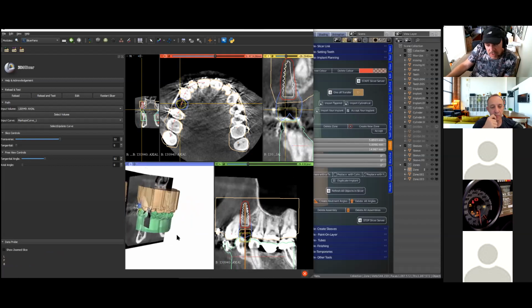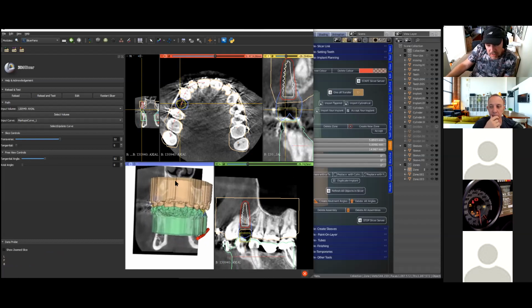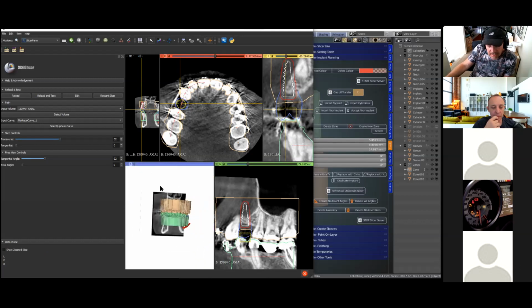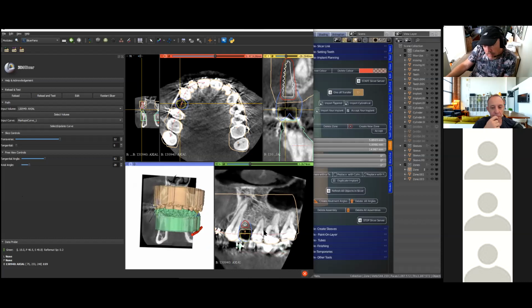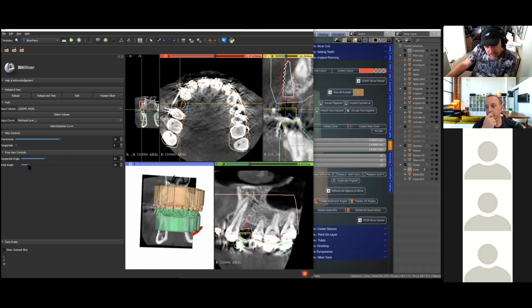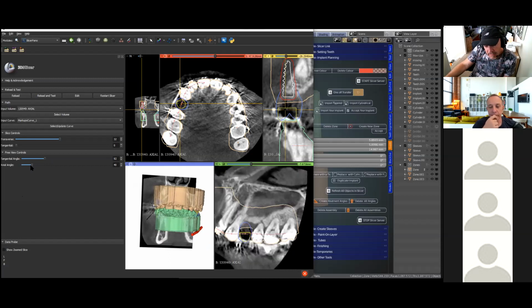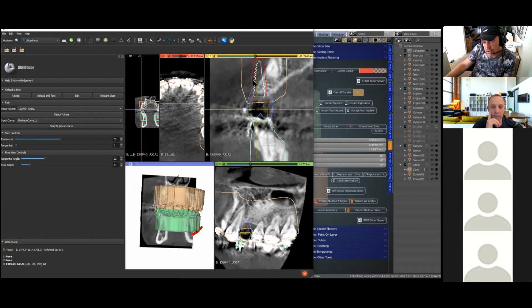And we also want to place that to the similar angle to the actual maxilla. So I've got the slice in view, which is over there, and we're going to move this actual angle across like that somewhere. So when I move this, I'll be able to see where this implant lies as well. So this takes a little bit of practice. Okay, we'll just leave it like that, more or less. So we're going to adjust and fine tune this one because it is way, way off.